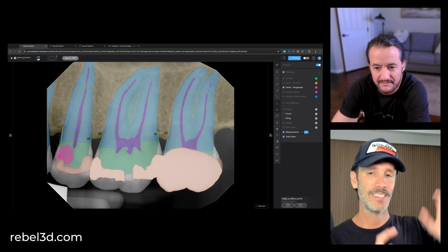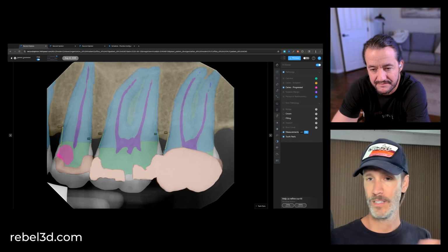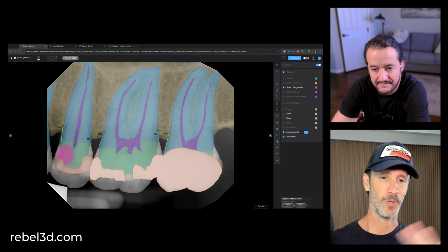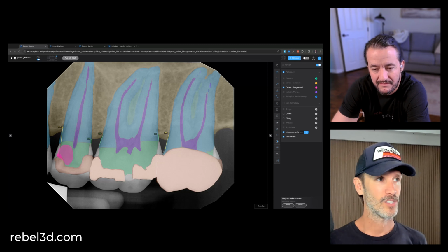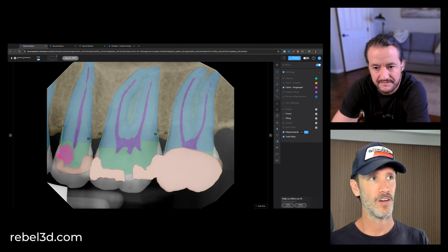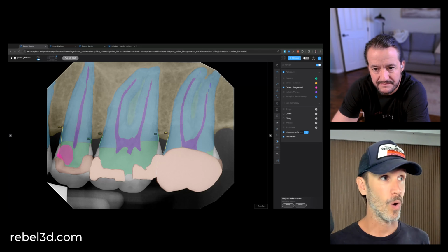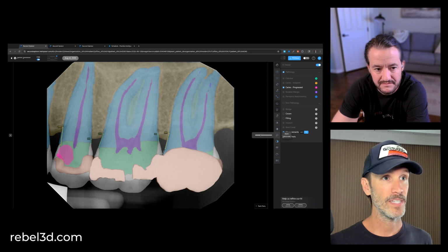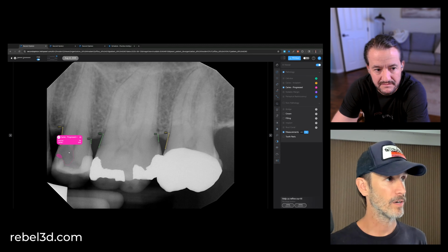And so this has this built-in trust because the AI has no reason to find more. It doesn't get any pleasure. It doesn't make any more money, right? And so having something that we can show them that is third party, non-biased, but also we can quantify. So even if I take off this tooth parts here and I go here, we say that this is mostly in dentin.